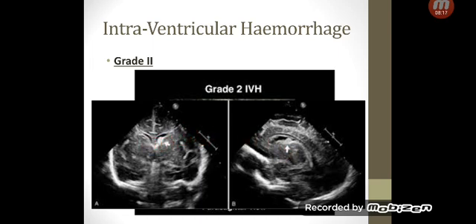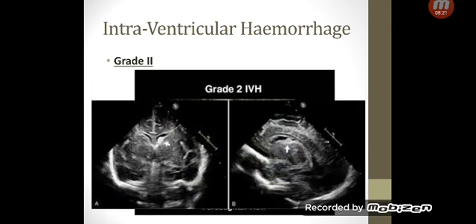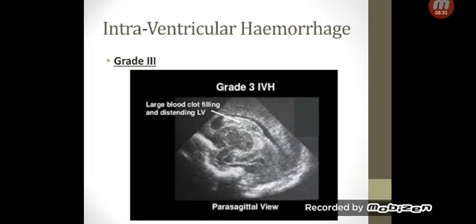So why do we have different presentations? Just because you need to appreciate that a hemorrhage doesn't always look like one picture. It can get different views, different pictures, different timing, which will affect how it looks like. And then with this hemorrhage, this is a bit of an old grade 3 hemorrhage because the blood is getting reorganized into a clot here.